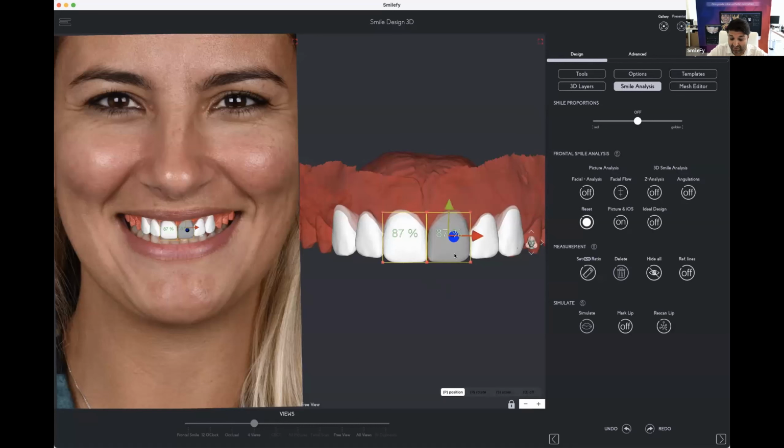Just imagine I do have now this central like this, right? I don't necessarily see that it is longer. I set my points, it's 83% ratio, means height 100%, width 83%. So I know, oh, that's the analysis of my smile. I'm gonna reduce the height like this, readjust my position, 87.